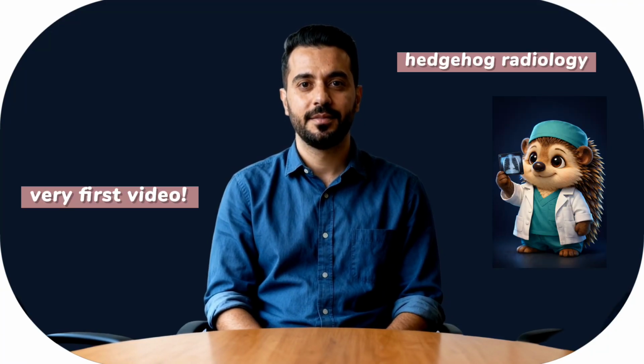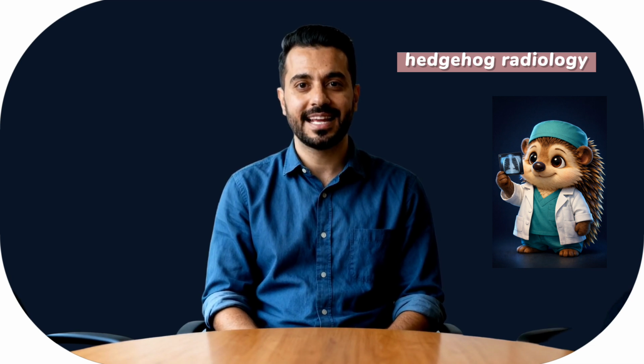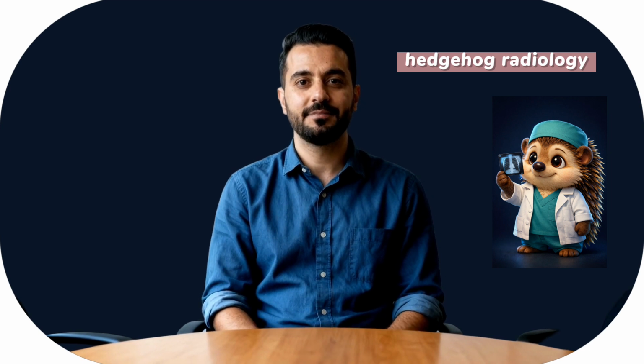What a treat! We will do the very classic thing, which is to learn how to read a chest x-ray. The chest x-ray is one of the most common imaging studies in medicine. We will go through a pretty simple system you can use every time, so you never miss a finding. Are you ready? Let's get started.